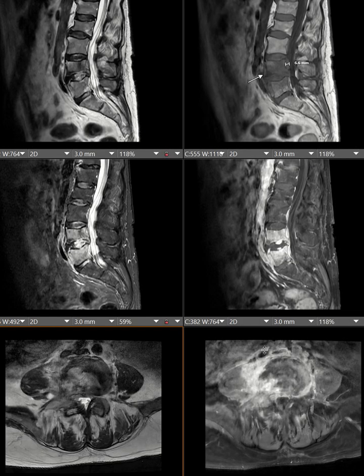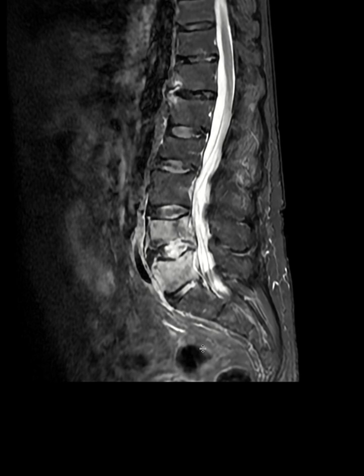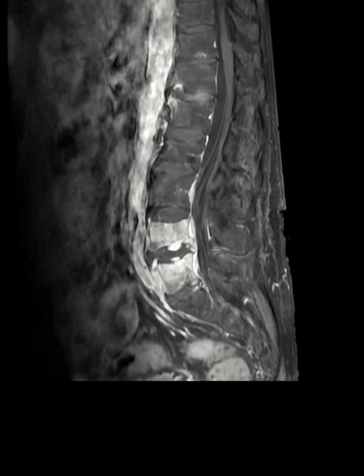Okay, so a very important diagnosis. Make sure you understand all these essential MRI sequences. Get familiar with them, especially if you are a junior resident. Make sure you are familiar with your STIR sequence, post-contrast T1 sequence, and then what are the important findings in Discitis Osteomyelitis you should report to your referring clinicians.